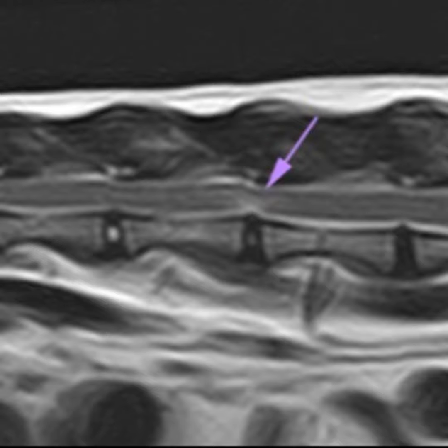We recorded the location of the affected intervertebral disc space, and for the number, we divided cats into two groups: a group with a single lesion and a group with two or more intervertebral disc herniations, so the multiple lesions. Intervertebral disc herniations included in the MRI field of view, but outside the spinal cord neurolocalization, were counted.